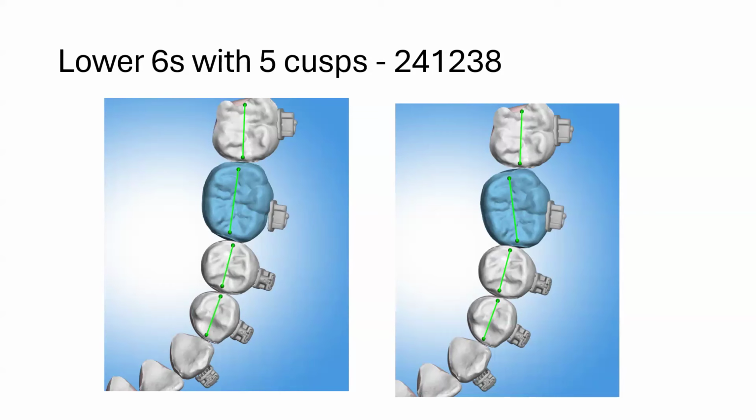And so you don't want to go in and take out that pre-activation. You want to keep that overcorrection that's built into this system. But I do smooth out the big discrepancies and things that just don't look right.